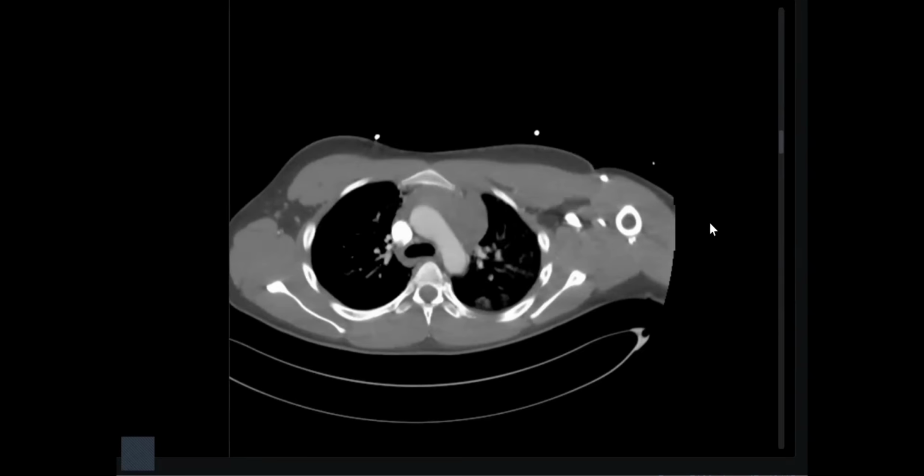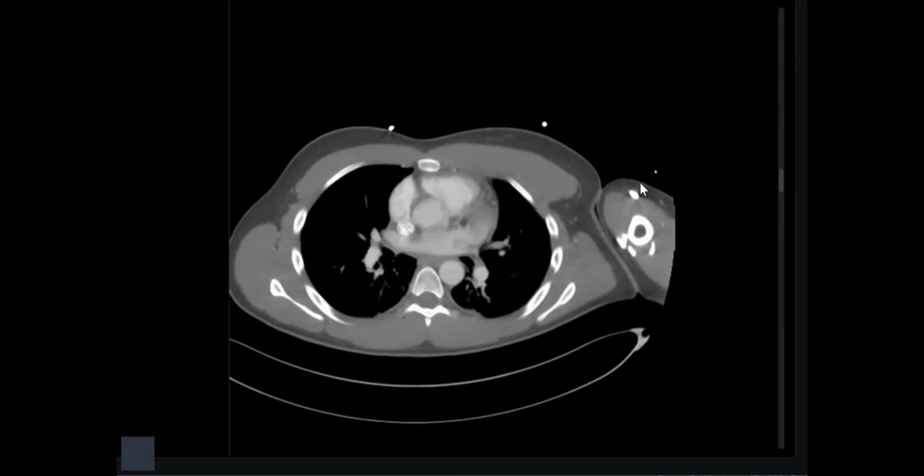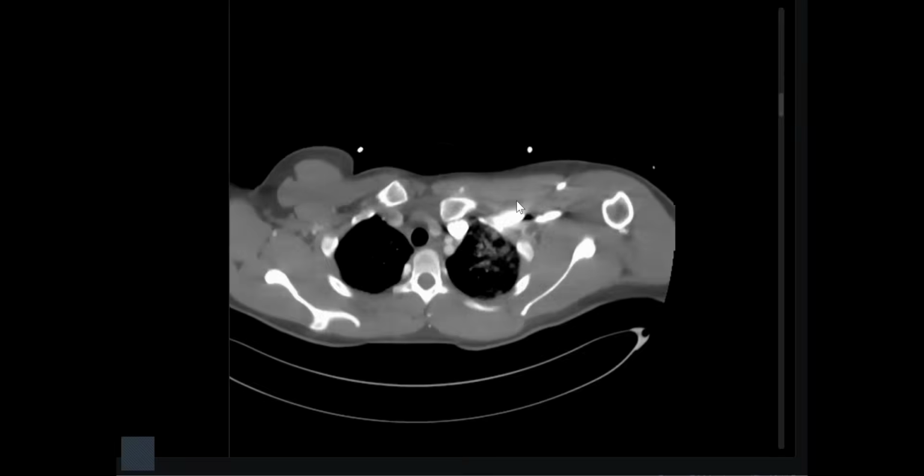Now I'm looking. I could see a faint flap-like thing at this level. No, it's just artifact. Okay. So now I'm concerned about the other vessels. Even hematomas can be formed by SVC rupture and other things. I'm looking at the venous system.